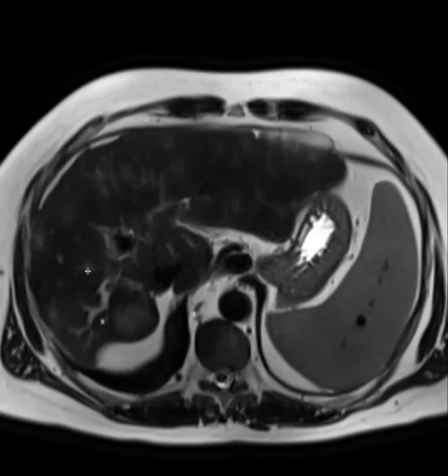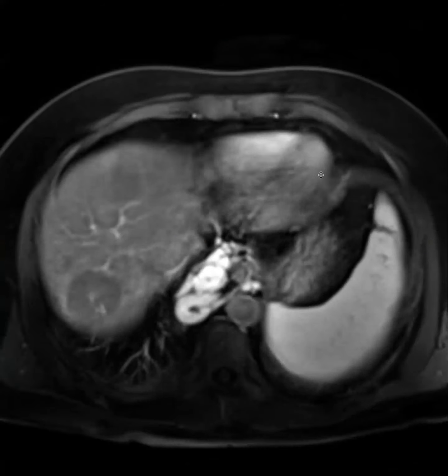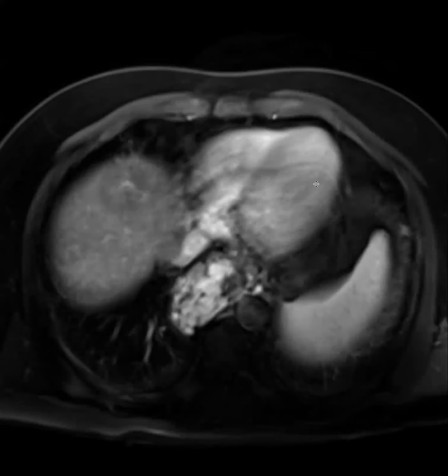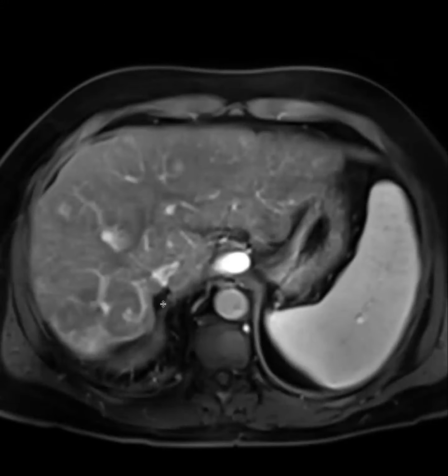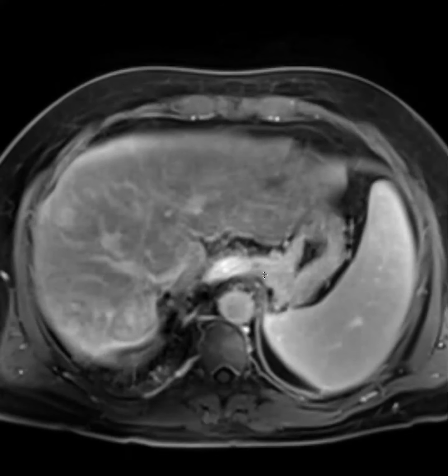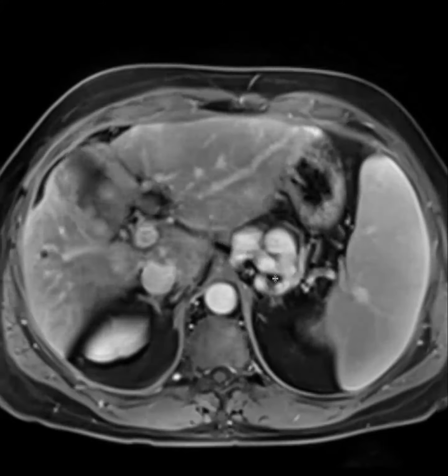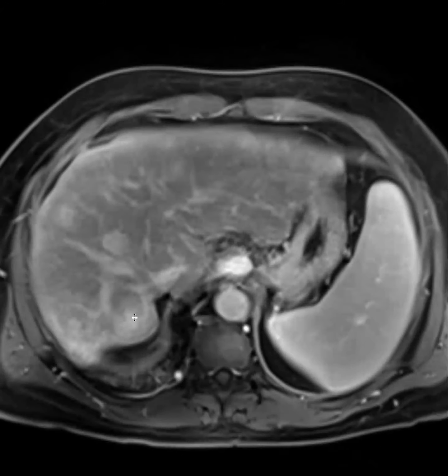Here it looks more gray than cystic. But I love this, that it really is filling from the inside out. And then if you go to the delayed, yes, they really don't look like true masses, like Rupa was pointing out before. It almost looks like that big one posteriorly has vessels going through it.